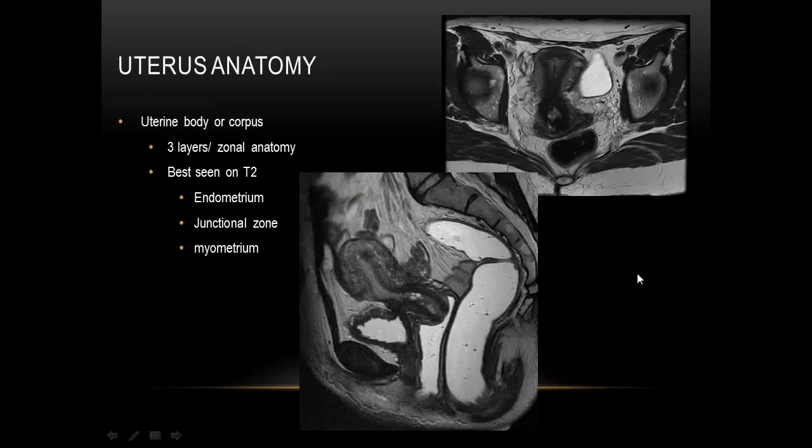Okay. So when we do our deep endometriosis protocol, we extend the rectum as well as the vagina with gel, which is nice because it outlines the anatomy. So this is an example of a deep endometriosis protocol. As you can see on this uterus, there is a deformity here that is her C-section scar.